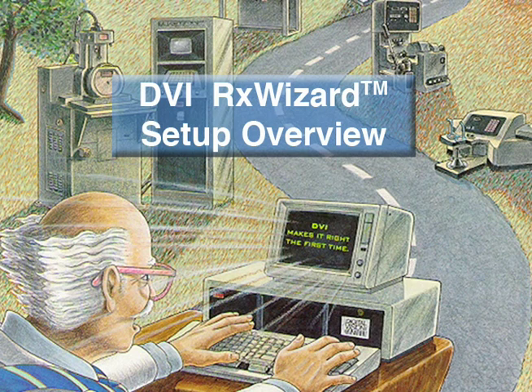If you have used the RxWizard before, but have deleted your copy, have the lab you wish to work with contact DVI for your information, and reinstall the RxWizard with the data provided. This is essentially the same process as if you were installing for the first time.